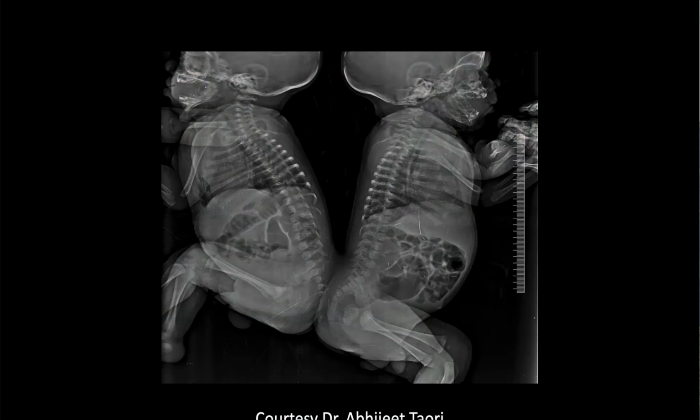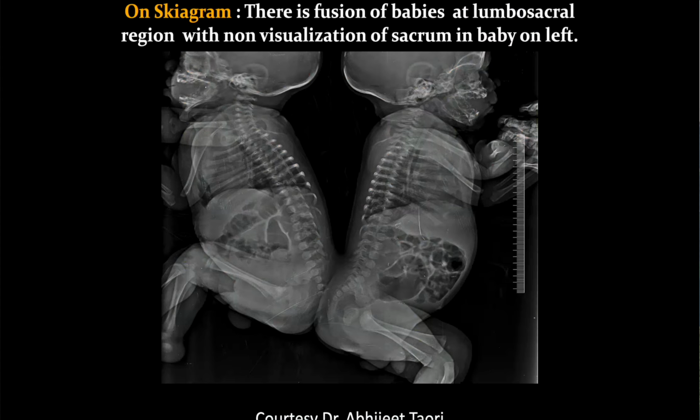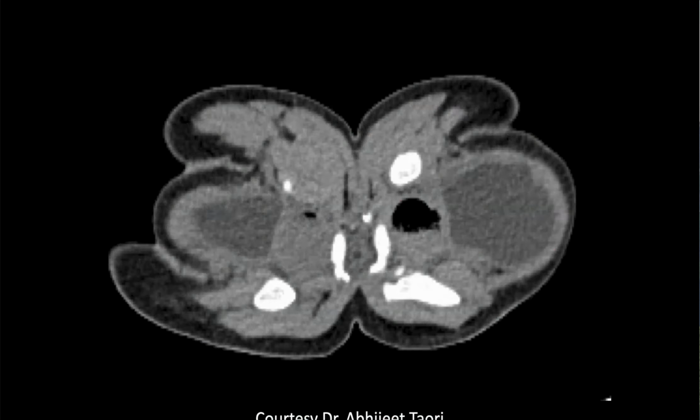Okay, so the radiograph, the baby on the right, radiology right, I don't see a sacrum. So you're talking about over here? Yes. Okay, so it looks like there's some of the sacrum missing here compared to the other child. Good. All right, then we go to the CT.